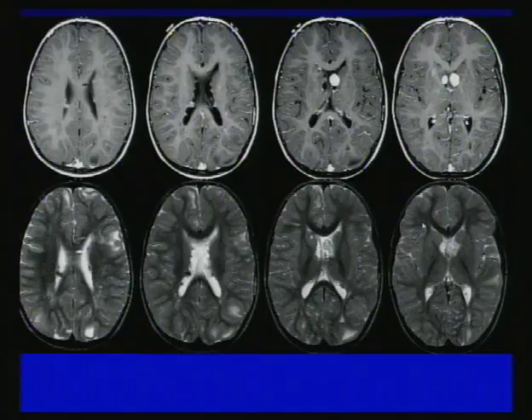So let's compare that to a patient who has these type of subependymal nodules. If you look at the signal characteristics of these nodules, they're not isointense to cortex. Some are lower in signal intensity, others aren't, so we suspect that they're calcified rather than blood products.